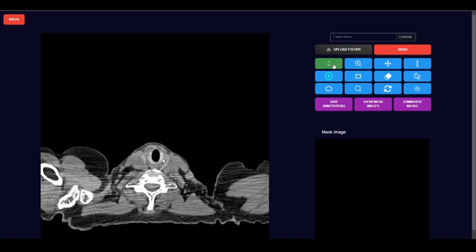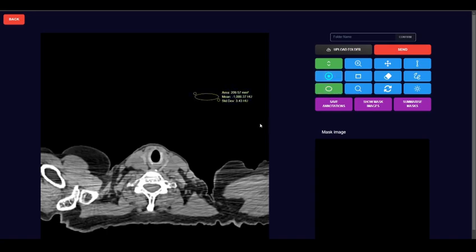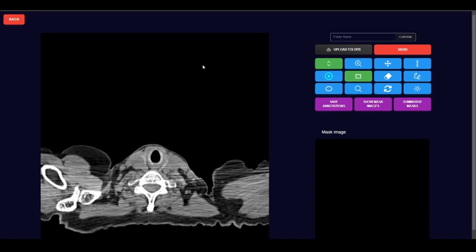Now, this basically lets us scroll and continuously make annotations. This stack scroll option is supposed to be continuously on. Of course, you can turn it off, but in our way of doing annotations, it works like this. I just mark a point, scroll down, mark another point, scroll down, and I can make other annotations like an ellipse or a rectangle, and I can just scroll down and make another freehand drawing. So this is how our way of making annotations works, at least in my head.